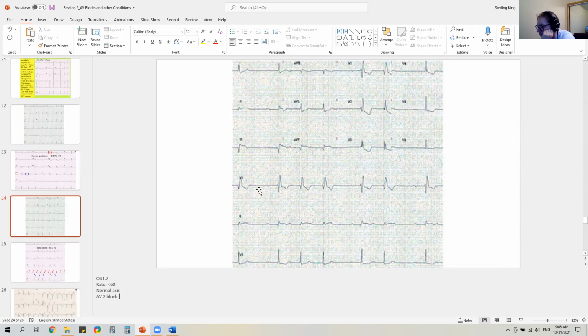So lead, we can try lead 2, I like lead 2 here, so this looks like PR. Let's go, this looks like about 2 boxes. And then we have 2 boxes. I'm actually just going to get a line.